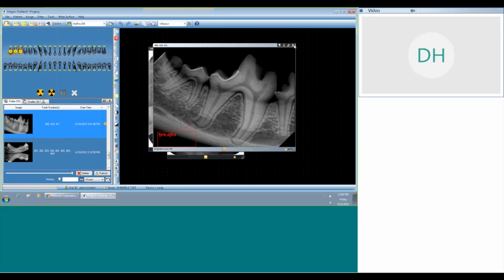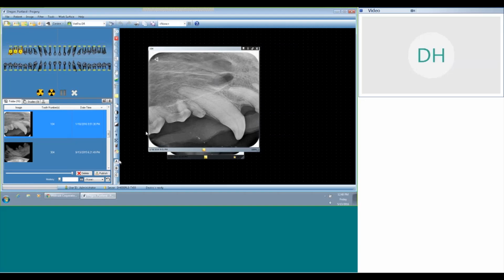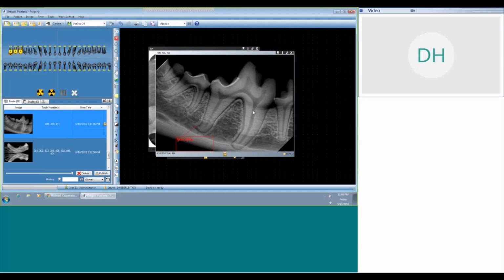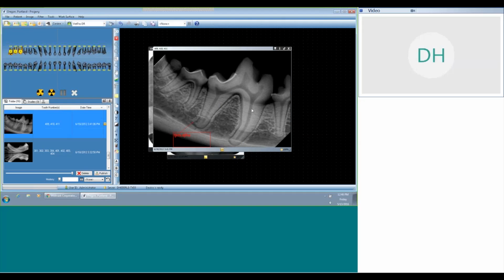And if I put it back down in the database and open it back up, it's still going to have all those filters. It's going to remember how we left it last. If you want to remove all of the image filters permanently for this visit, you just click that little daisy. It's going to ask you, do you want to undo all image filters? You're going to hit yes, and now it takes you back to that original. And now it's removed all those filters that you applied.